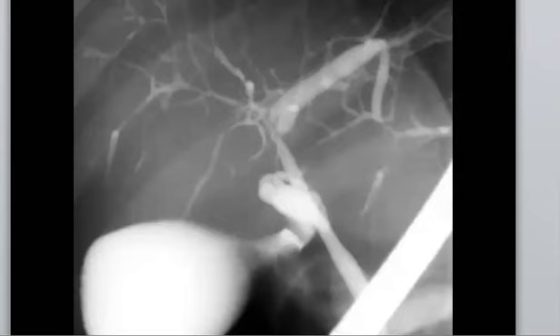It is cholangiographic. So what is it equal to? There is abnormal arborization of intrahepatic biliary ducts, and there are some strictures and some dilatation affecting the left hepatic. So this one is primary sclerosing cholangitis.